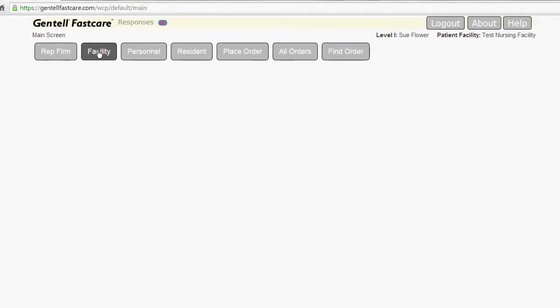In this lesson, we're going to talk about the facility, personnel, and resident buttons. But before we do, let's look in the upper right-hand corner, and you'll see that it's telling us a little bit about ourselves. We're a level 1 nurse, logged in as Sue Flower, and the patient facility is the test nursing facility. Of course, this isn't real data because that wouldn't be HIPAA compliant.